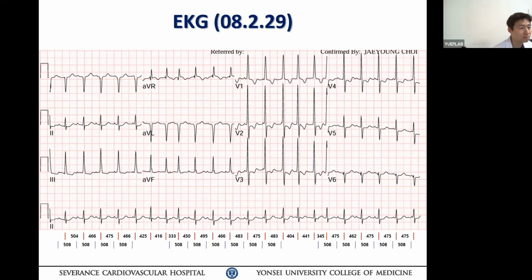What do you think about the P wave? I think the P wave is still related to the sinus node. So you don't think it is an atrial tachycardia? It depends on the age of the baby, but I think the P wave axis is still within sinus range. Obviously a child has a more vertical P wave, but lead two is positive, three is slightly positive, so aVF is positive. aVR is negative, and lead one is biphasic.